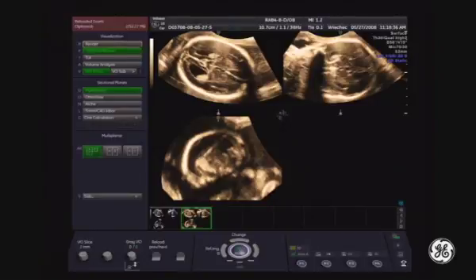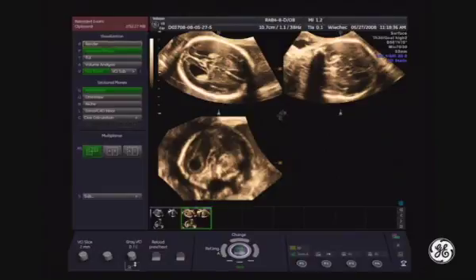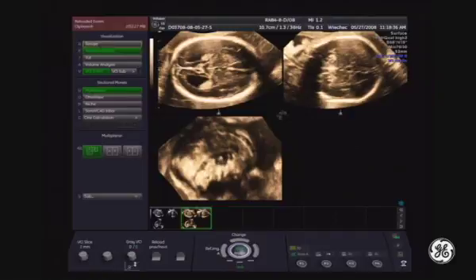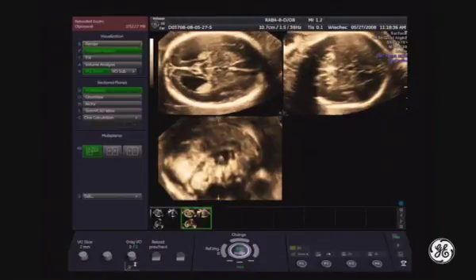So I will start with selecting the reference image A, and I activated the pivot point. Then I go for Z rotation here, and I check if my B plane is also horizontal in regards to the midline. I'll correct it a bit. Let's make it a bit bigger.